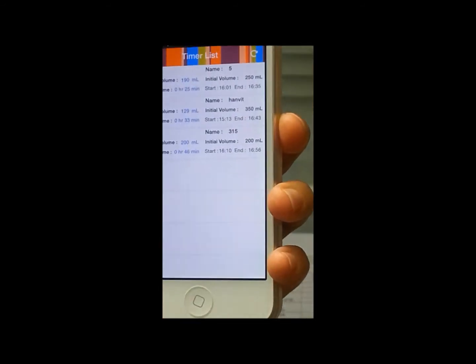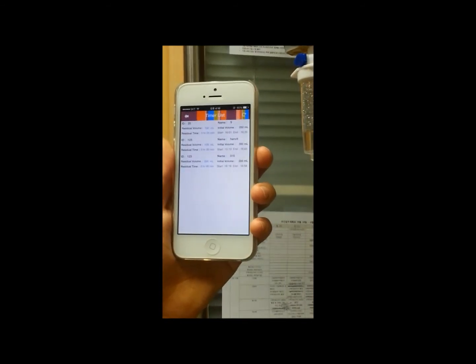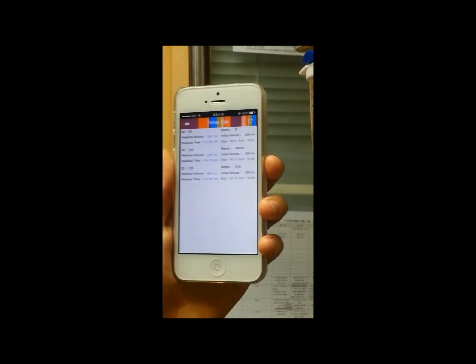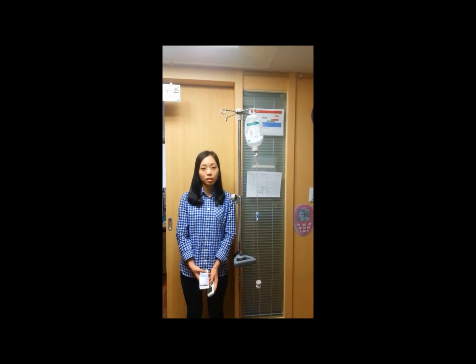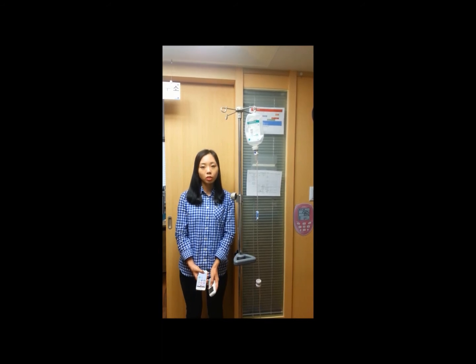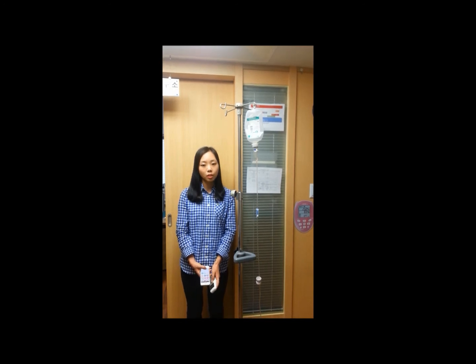After that, the alarm will ring at the end of the IV therapy. A patient list will then be displayed, which will show the exact time the treatment will be finished. As you can see, the IV Therapy Helper provides effective professional nursing care and a higher level of comfort and trust to patients. It is efficient in terms of time management, cost, and control of process. It guarantees that doctors give higher quality and safer treatment to patients.